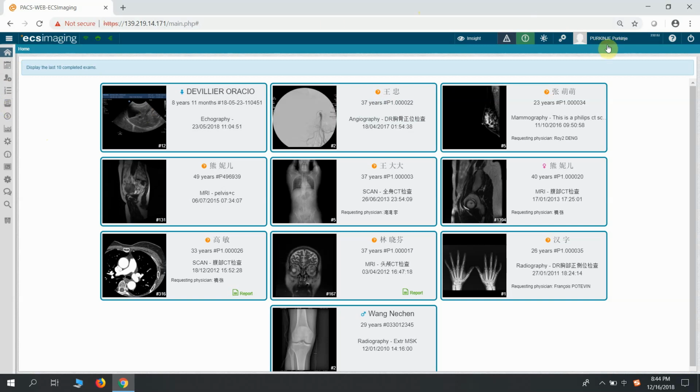Here is my username. Because I am an administrative staff, you can see a lot going on. And here is the home page when you log in as an administrator, and this can be configurable depending on different profile.